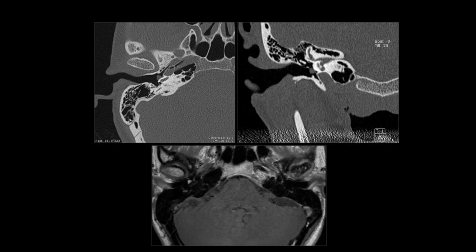They look different clinically, and also on imaging, the vascular tumor should enhance. This is probably hard to see, but you can see that there's an enhancing focus. You don't see it on the other side. So this lesion does enhance. Therefore, this is not cholesteatoma. Rather, this is a vascular tumor. This is a paraganglioma or glomus tympanicum.